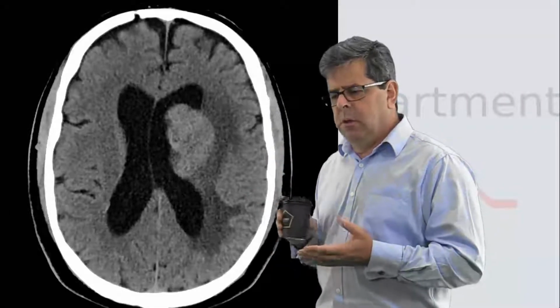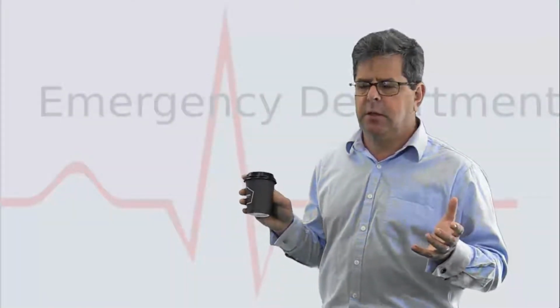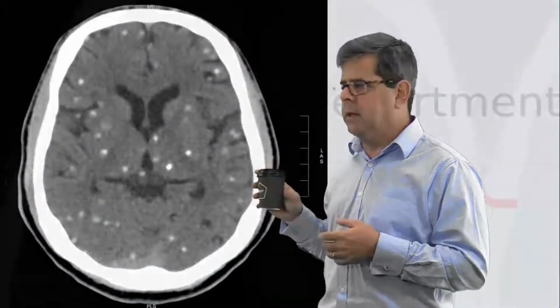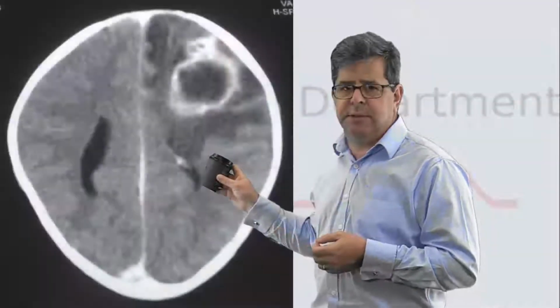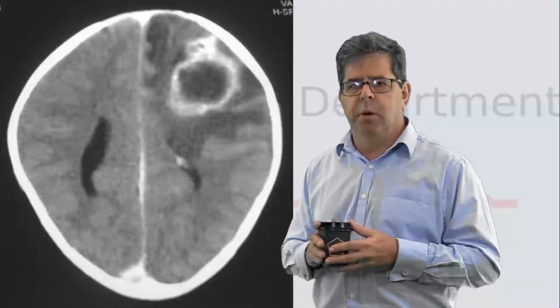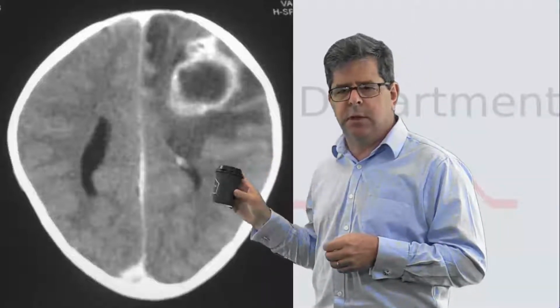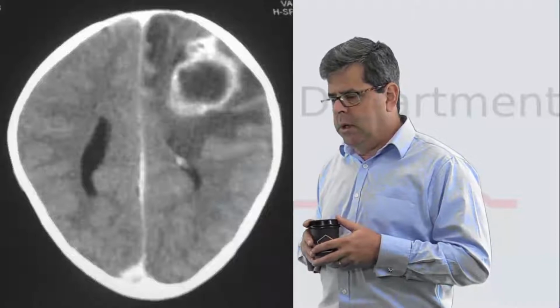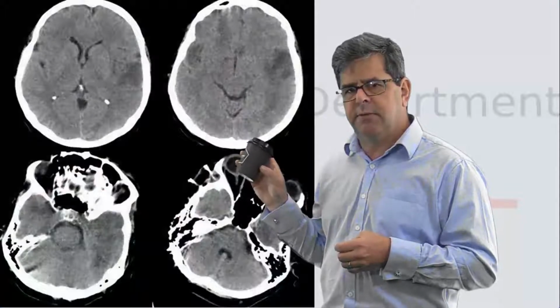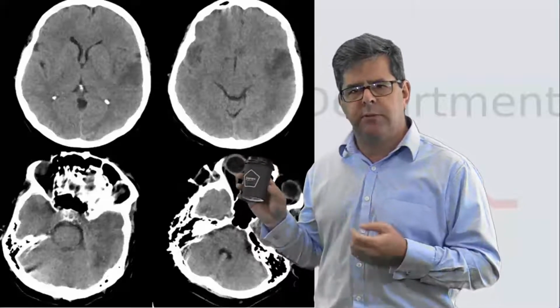Okay, so we mentioned cerebral abscesses. There are a whole heap of infections that you can find inside the brain, and they have variable appearances. This is like a coccidioidomycosis, looks like that. Cerebral abscesses, amoebic abscesses. So they have a whole group of infections, and that's really why we pay radiologists, so that they can interpret some of these things before we get tissue diagnosis. There's another infection here that's worth remembering. This is actually the appearance of HSV, herpes simplex infection. And you can see where it's got that predilection for the temporal lobes.